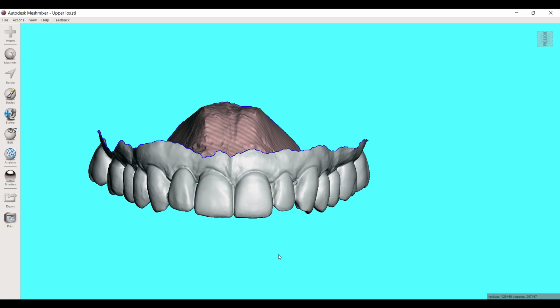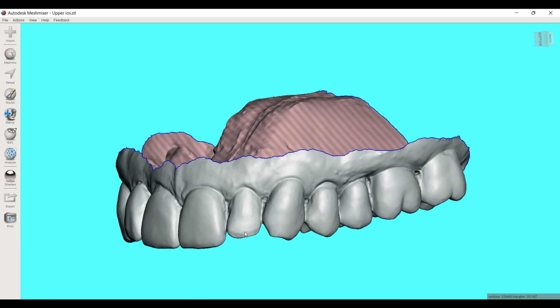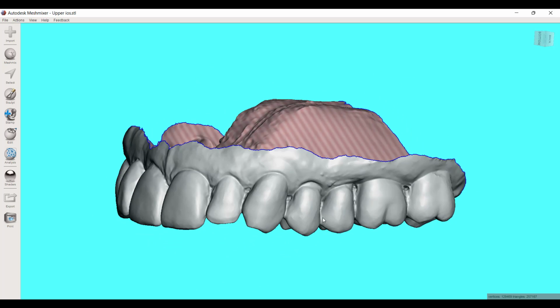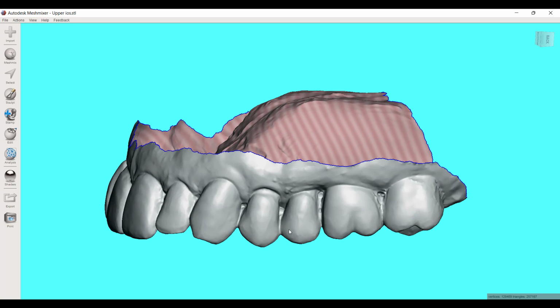Hi, it's Corey Glenn, and in this video we're going to keep it really simple today. I think I made a video of this a long time ago, but had some recent questions from some people just starting out in printing. So the question is just very basic. How do I take my intraoral scans and then print those models, right?